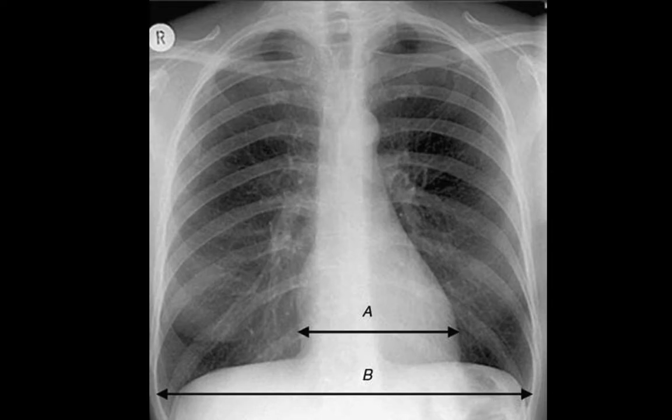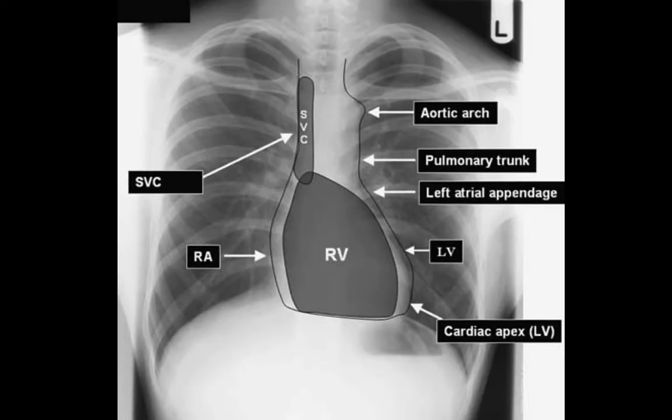This is if it is a chest X-ray PA view. But in case of children, or in case of a chest X-ray AP view, this can be up to 60%. I mean, if the transverse diameter of the heart is 60% of the total chest diameter, then that is also normal. I am saying this about the common things. And about measuring, one thing is very important: the measurement should be from the medial margin of the chest wall, not from here. It would be from here, both sides. Okay, I think you can now measure and say whether the heart is enlarged or not.